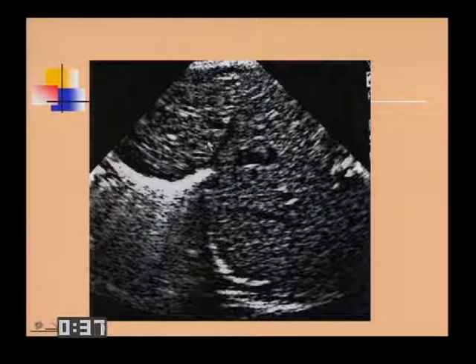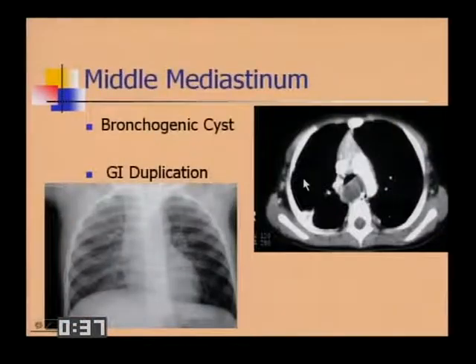Ultrasound can be used for a lot of these lesions in children. The children are so small, the transducers fit large parts of their body so that you can see liver. You can get a lot of land, so to speak, in a child of this age.